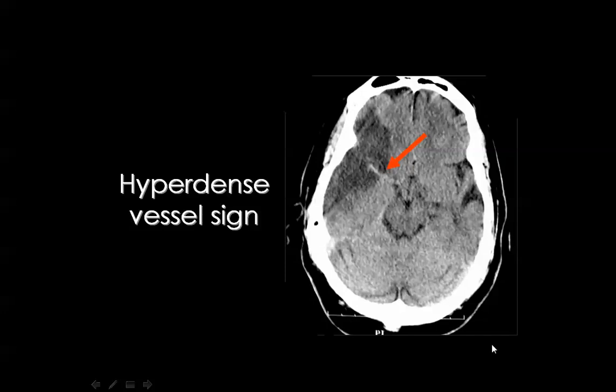And the infarction is usually the result of arterial thrombosis or embolism, and the artery is occluded, and the occlusion will appear exactly like the hematoma, and the hemorrhage in the CT will appear hyperdense like this. This hyperdensity is present in the middle cerebral artery corresponding to this infarcted area, and this is what we call the hyperdense vessel sign. The hyperdense vessel sign means that the middle cerebral or any one of the major vessels is thrombosed, showing hyperdense course, indicating that the area supplied by this artery is infarcted.